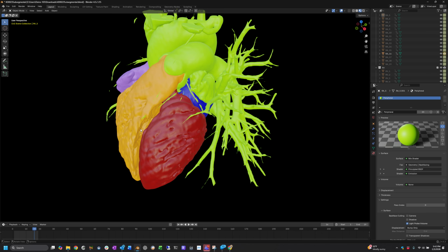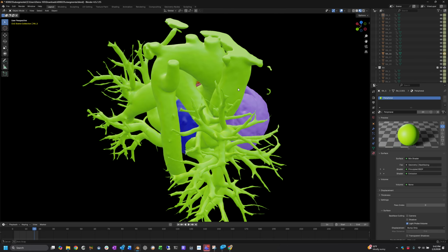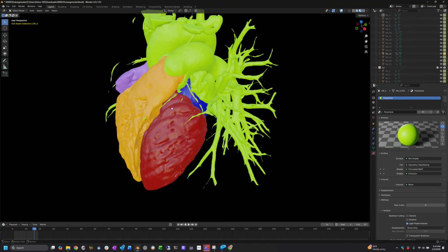So before we park this and say it's ready to be part of the training, we need to fix the atrial appendage and the right atrium. And I think, okay, we can leave the LVOT and the mitral stuff for training. I think we'll have enough as we get better at that. The error will average out.